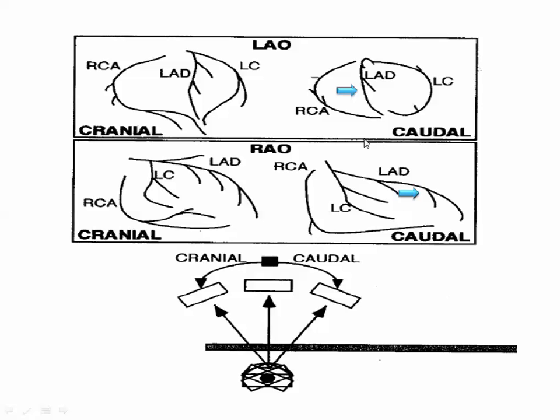If you can see my hand here? No, it's foreshortened for you. What if you can see it here? Straight, so it is cranial. What if it is caudal? You can see it. So from the caudal, what can you see? The proximal segment. While cranial you can see the mid and distal. Clear, Doctor?